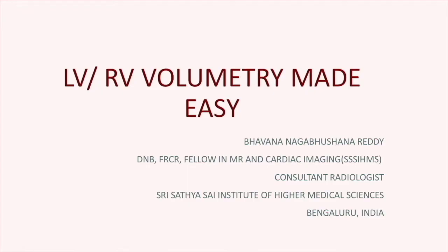Functional assessment of cardiac MR studies is an important component of the analysis. Multiple softwares are available, which are often very expensive and not easily accessible. In this session, Dr. Bhavana will be concentrating on one of the freewares where you do not have to pay anything to assess LV and RV function and volumetry. Please note this is just a demonstration of one such product, and there may be many other products available in the market to do the same job.